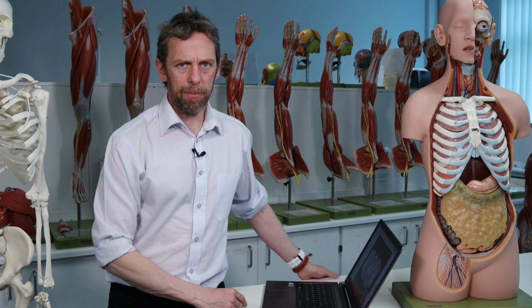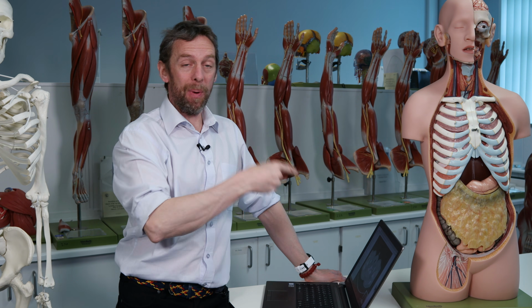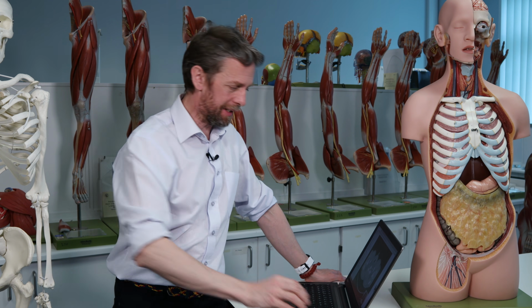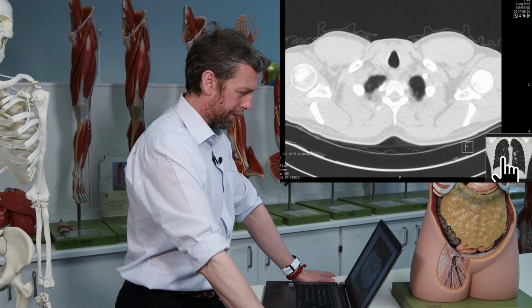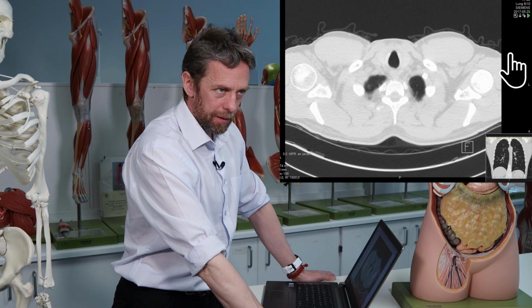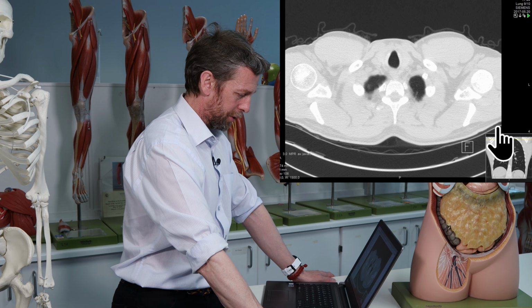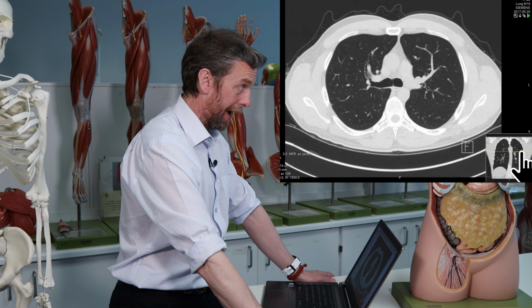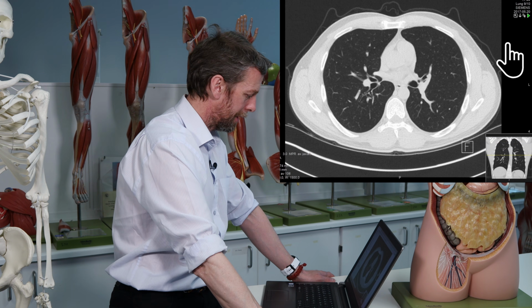The image sequence that I'm using is in the public domain and it's on Wikimedia Commons. So in fact, I can put a link to this below, and if this page still exists in the future when you're looking at this, you can also scroll through these images. In the bottom right-hand corner of the image, you can see a yellow line, and that shows you the level that we're at. You will also hear banging and drilling because they're building a new pharmacy department.